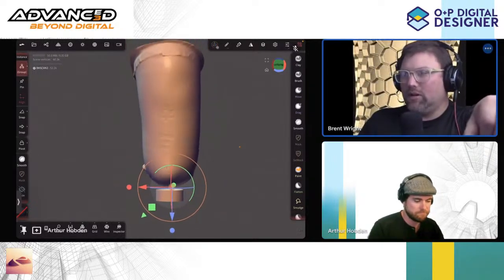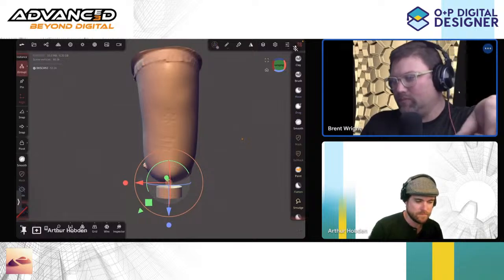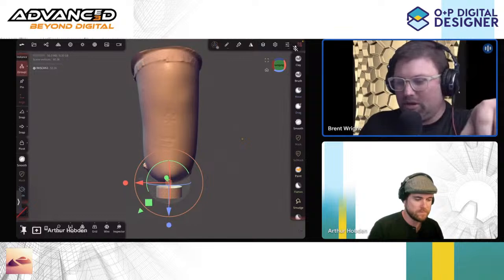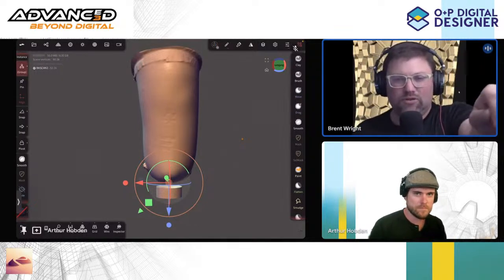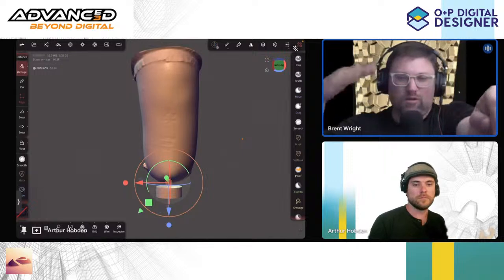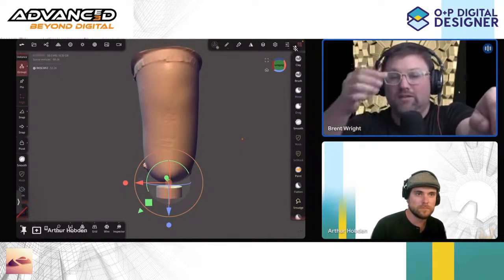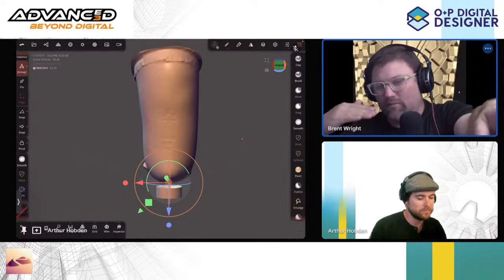As far as your height goes, there's typically an umbrella that has a little button on the bottom of it. When you're fabricating these traditionally, you typically take a Surform and cut it off flat until the bulldog will sit flat on the model.